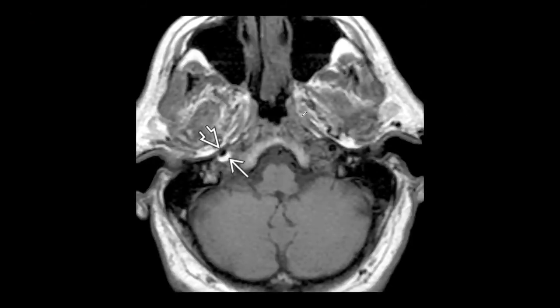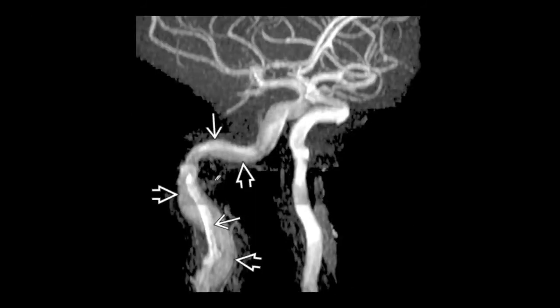Okay, this is another patient. Here in the region of the internal carotid artery, normally you should just have a flow void. Instead of a flow void, you also see hyperintense signal. And this sequence would be a T1 sequence because the CSF is dark. So when I start seeing a difference in signal within the vessel, then it's time to get an MRA or a CTA, right?